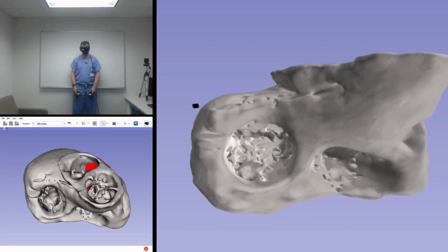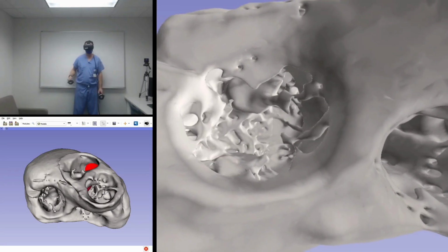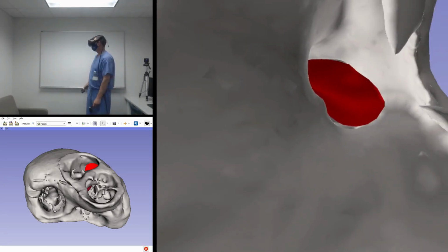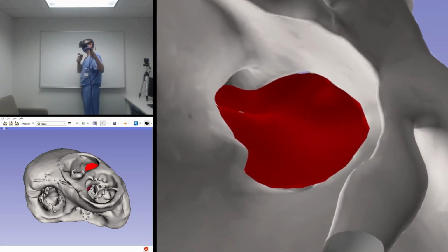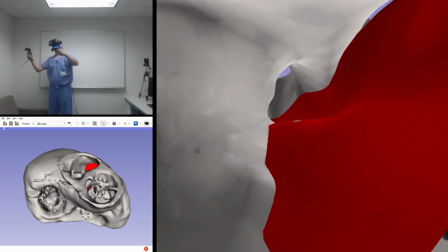Next, we show a baffle connecting the left ventricle to the pulmonary artery. Once again, stepping into the left ventricle of the model, we can visualize the baffle from the VSD up to the pulmonary artery. This pathway appears unobstructed, but because this would make the right ventricle the systemic ventricle, this was not strongly considered.